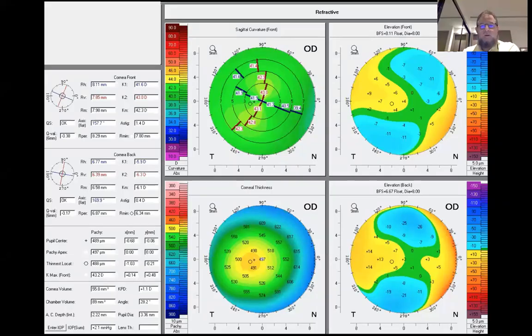Now we come to the Pentacam of this patient. The average K is 42.3. There is no inferior superior difference. There is no skewed radial axis. The anterior and posterior elevation maps are within normal limits. We can say that there is a kind of horizontal displacement of the thickness map apex. The whole pattern is displaced horizontally, and that's because of high angle kappa. If you look at the pupil center coordinate, you will find that the X is 0.68.